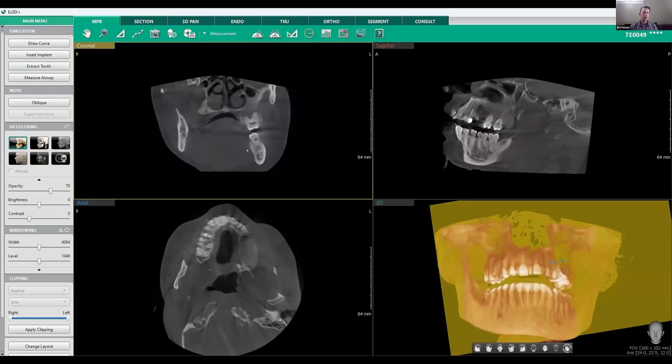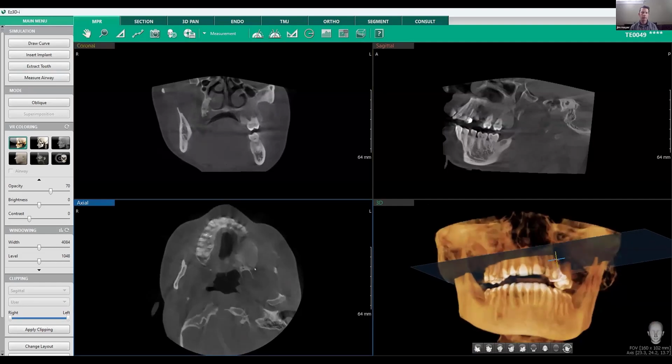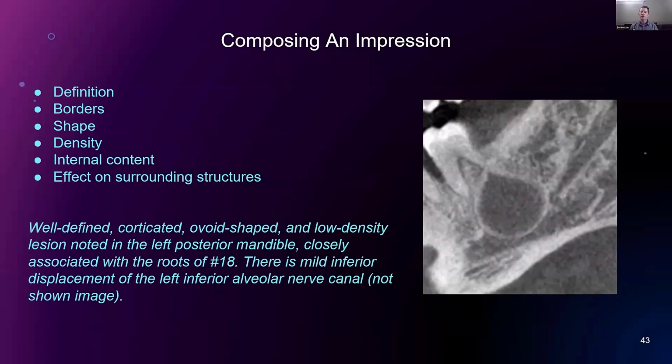That axial slice is a great example of looking, when you do your comparison right to left, contralateral, just a general overview of what we are seeing when you identify some of these pathologies. It really goes back to the first session we had of how we look at these: top, bottom, front, back, or inferior, superior. That's going to show us that difference. Absolutely. And that's why it's so important to orient yourselves so you can compare both sides equally. Dr. Bakari, thank you for taking us through those cases.